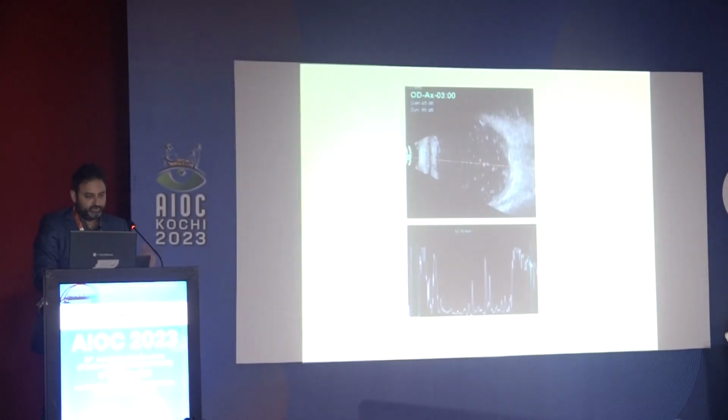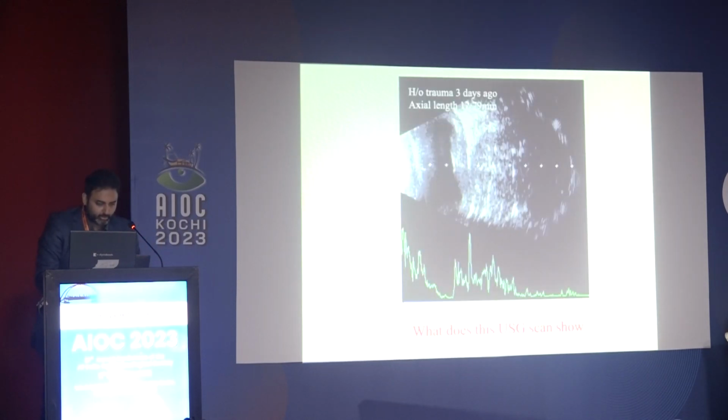That is asteroid hyalosis. I'm quickly going to go over that. I want to definitely discuss the membrane-like structures and then ask four questions of you, and then that will be that. So just wanted to ask, what does that ultrasound show? That's all the information I've given you.